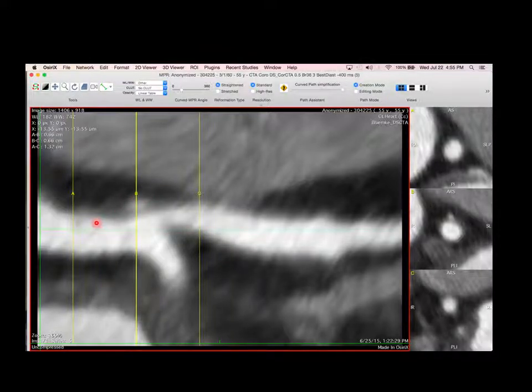And now this is where, if we were engineers that could make CT images with 10 times the resolution, it would be useful, because you're trying to image whether this wispy thing here, that lesion, is actually a bump on the outside of that vessel. I don't know. It's hard to say, right?